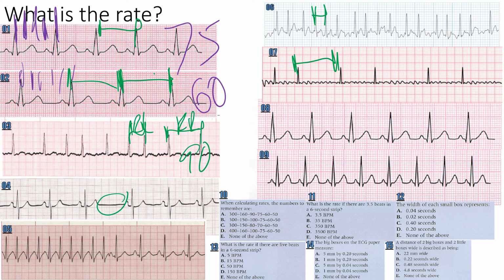There's extra space there. If I cross my eyes and close one eye, it looks like a little bit of extra space there, right? So it might be just a PAC or something, which it looks like it is. But if it's irregular, let's just assume it's irregular. What do I got? 1, 2, 3, 4, 5, 6, right? So heart rate is what? 60.